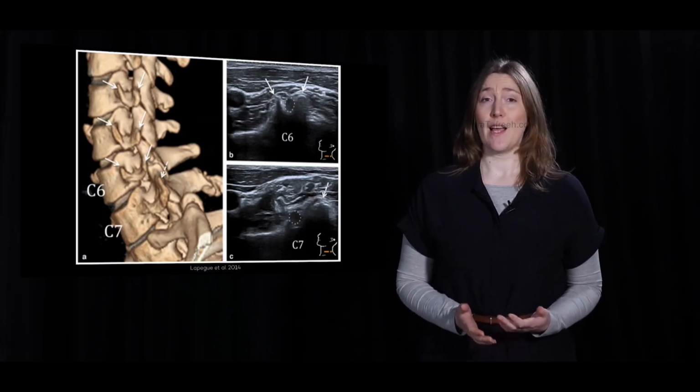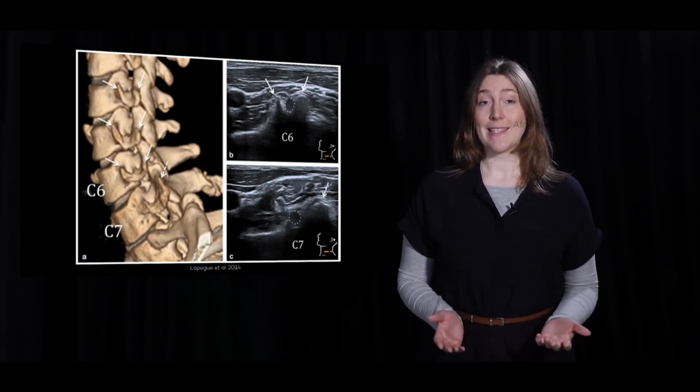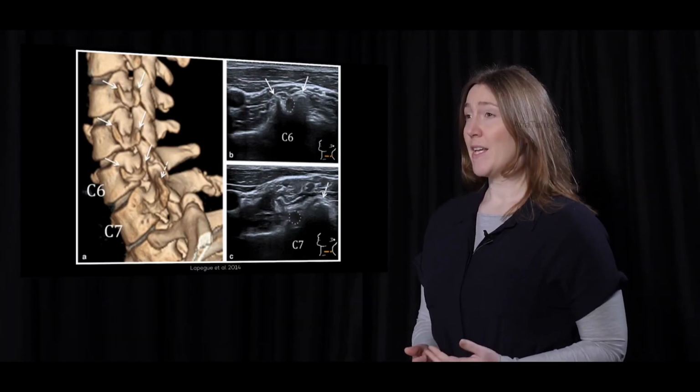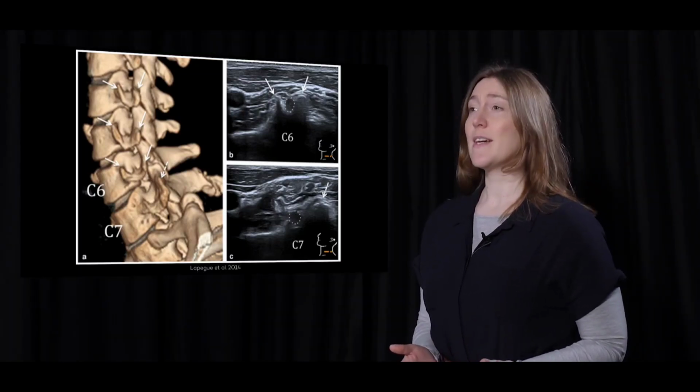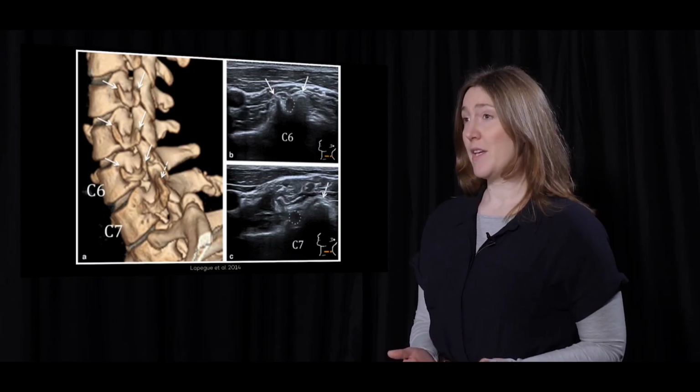In the next 4 slides, I will use the brachial plexus and the median nerve in the arm as an example. Ultrasound examination of the brachial plexus is, although at first sight difficult, perfectly feasible with fairly rapid practical and theoretical training.